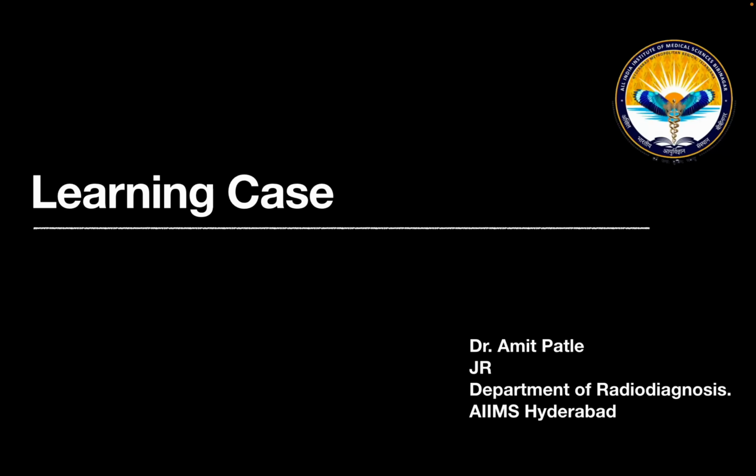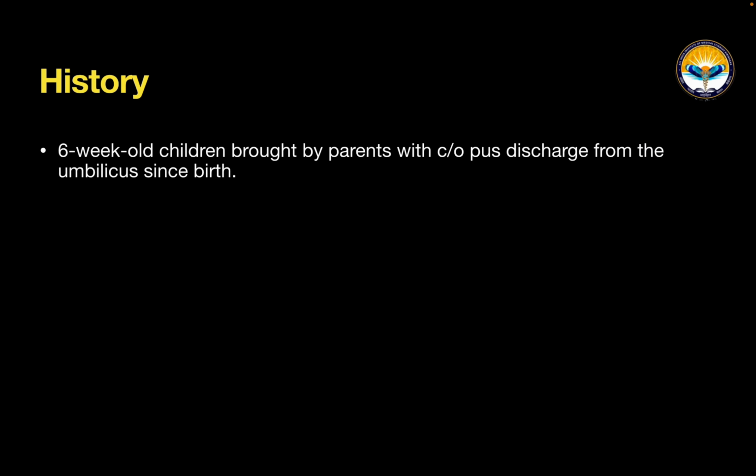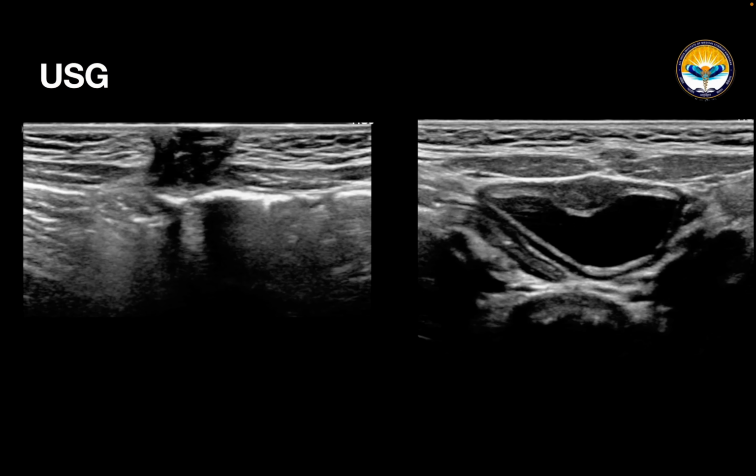I am a junior resident in the Department of Radiodiagnosis at AIIMS Hyderabad. Today, I am going to present a learning case on urachal fistula. The history was a 6-week-old child brought by parents with complaints of pus discharge from the umbilicus since birth. The patient was referred from pediatrics to our department and we did a USG.